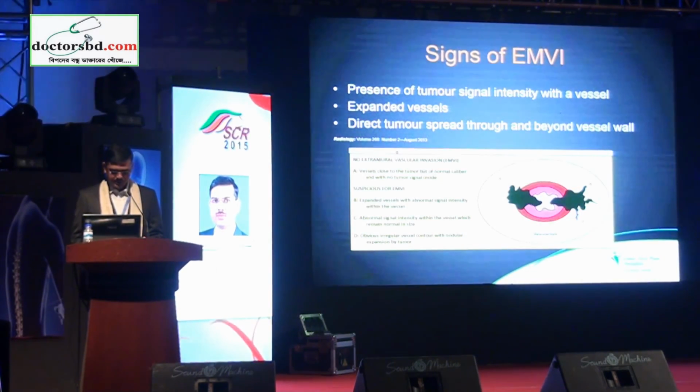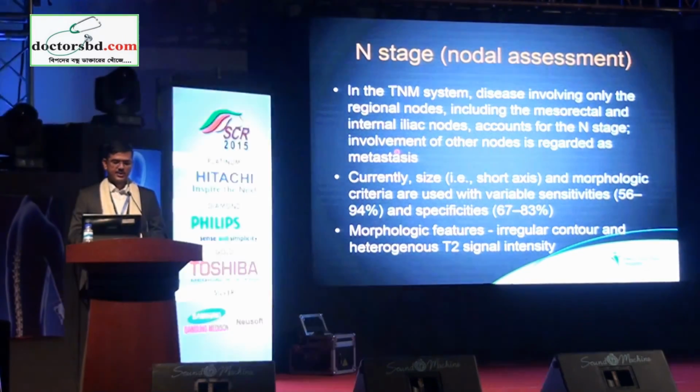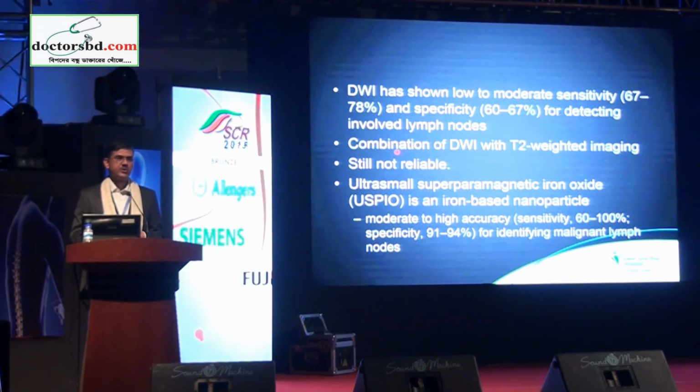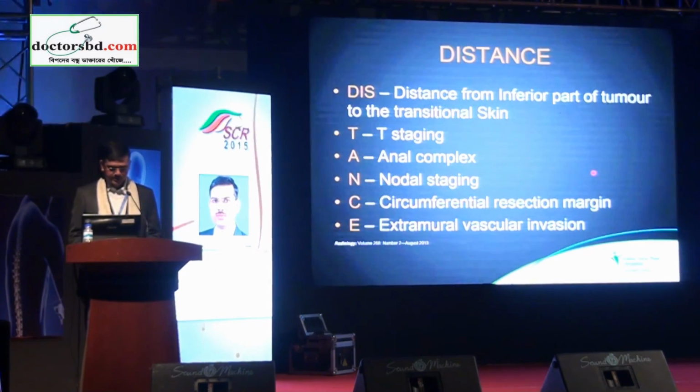I will skip this. Nodal assessment can sometimes be controversial, even on MR, but there are different techniques which are coming up. Not only do we use the routine T1 and T2. Template reporting is very important.